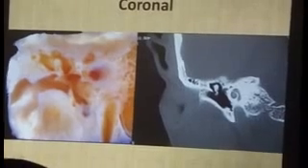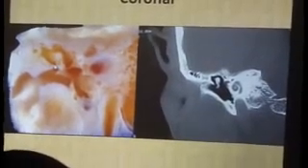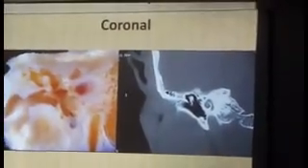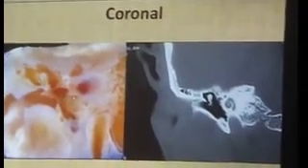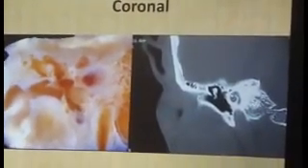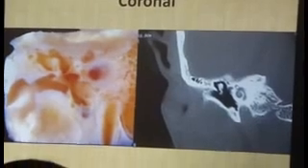Right. We move more anteriorly, and now we see the incus here because this is a gross section. So it's more three-dimensionally oriented, whereas a CT scan and HRCT is a sub 1 millimeter cut. So this is isolatedly the head of the malleus. Whereas over here you can still see the head of the malleus with a part of the body of the incus behind. Anyway, this is the head of the malleus, again neck of malleus, lateral process, and the tympanic membrane over here and over here. You see the basal turn of the cochlea and the two segments of the facial nerve, that is the tympanic segment and the labyrinthine segment.